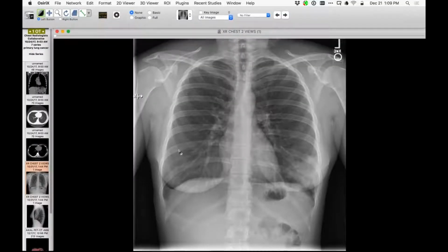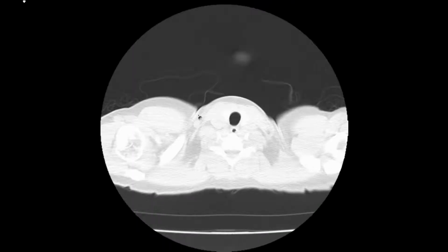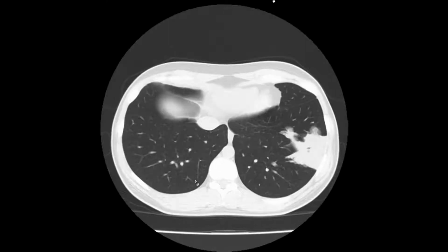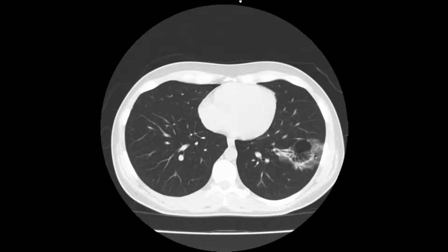But it didn't get better. The patient's symptoms, and I can't quite remember what they were, did not resolve over time. So the CT that I have here was not at the time of the initial presentation, because I see the dates are off, but this is a representative image of it. So when we scroll down and we go to the lower lobe, here is a focal opacity, and it's got an area of ground glass attenuation.